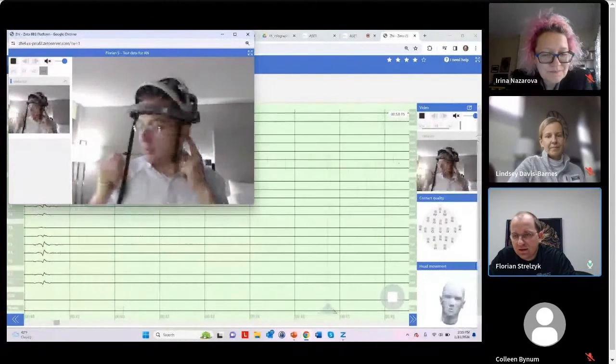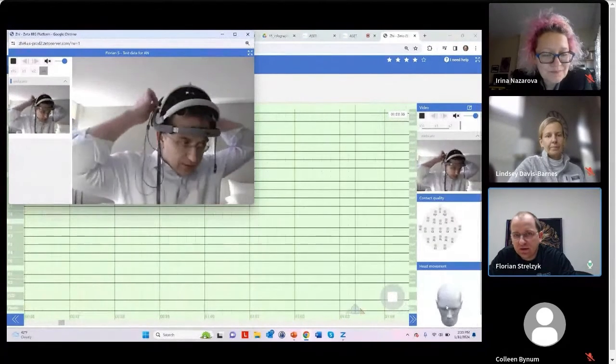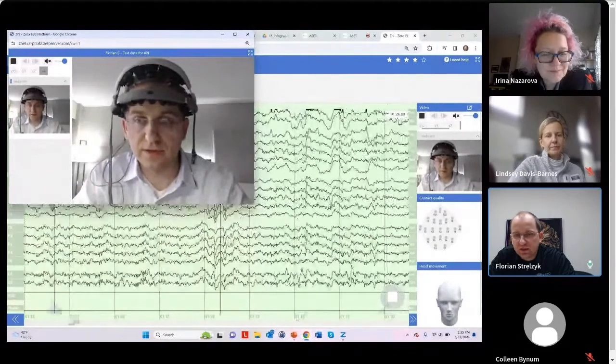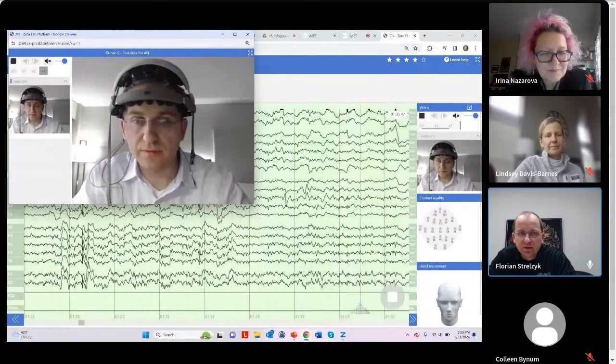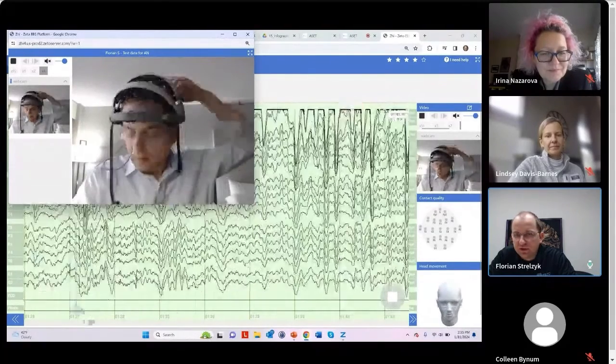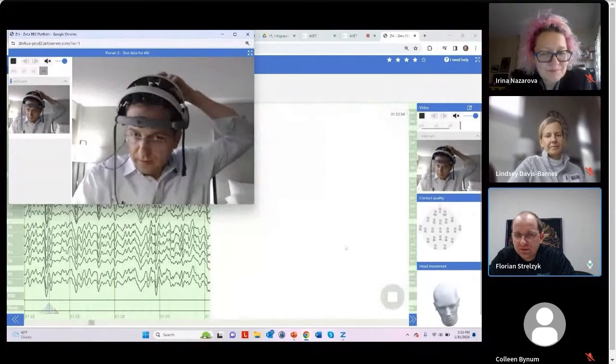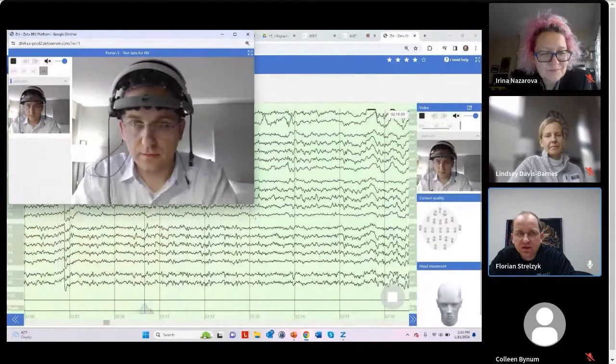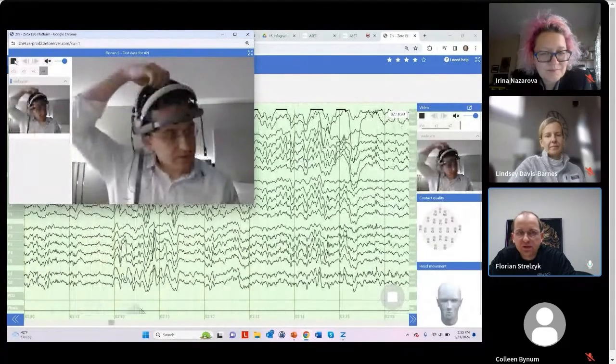You see the head movement dummy here. So obviously as I'm moving, this dummy moves. And now you see me here after 1 minute and 30 seconds. I'm finished with the setup, making some more adjustments. And here we go. So at about 2 minutes, 30 seconds, I think I was finished with the setup.